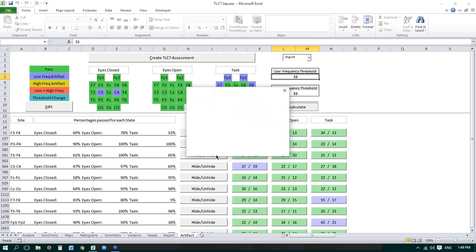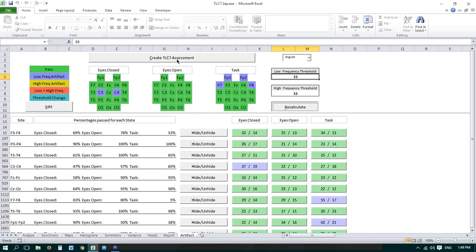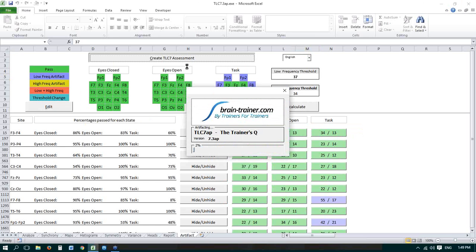Once we get that data ready, this is basically where you would start, because your data would come in already artifacted. And there's a place when you're gathering the data in the first place that you can say, don't artifact. And it jumps right over this process. There's a little button. So by clicking on this now, what the file is doing is going through and actually removing all the lines of data that are considered to be an artifact, and then creating all the various different views of the brain, so that we can take a look at it.